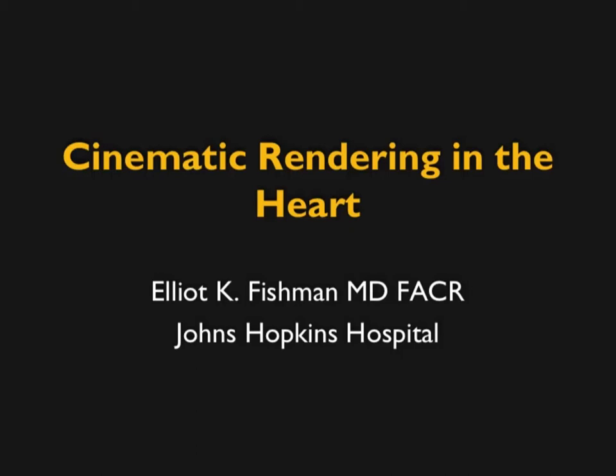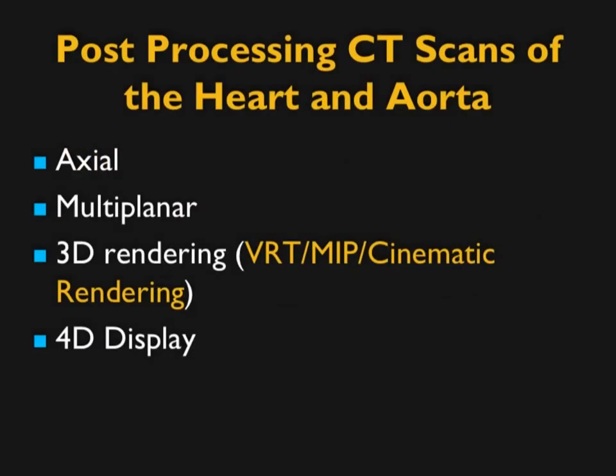So we've spoken a number of times now about cinematic rendering, and we're doing a refresher course at RCA, and I've been asked in many places to speak about specific applications, so this one is really heart and aorta. We talk about the role of post-processing in looking at complex structures, and the heart is a good example of where it should work well.